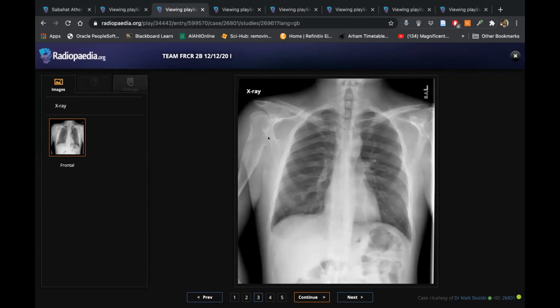This was widening because this is sessile osteochondroma. This is part of sessile osteochondroma. This is sessile, like these are broad-based. You cannot see anything here, but even with this lesion, you do not see any periosteal reaction, right? No cortical destruction. It seems to be an out-pouching or projection, but it's not pedunculated. It's broad-based or sessile. Okay.